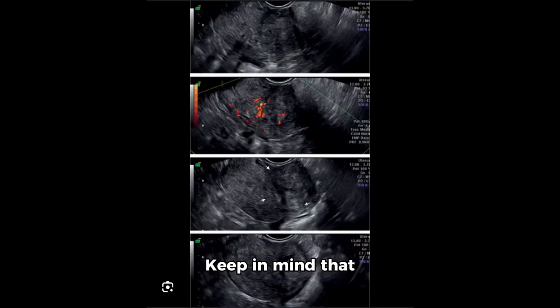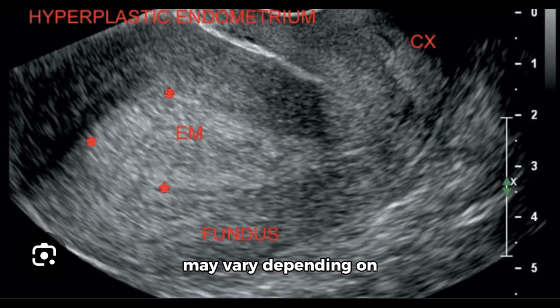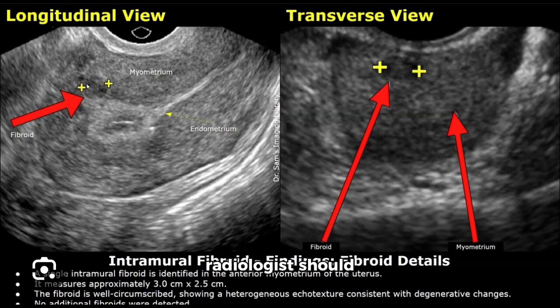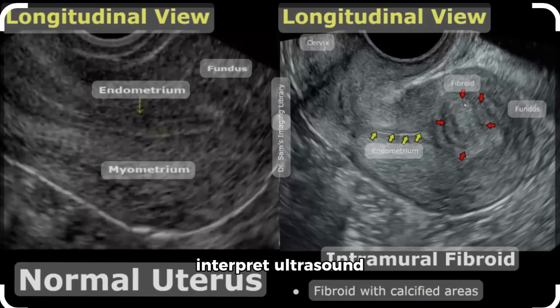Keep in mind that ultrasound features may vary depending on the size, location, and type of fibroid. A healthcare professional or radiologist should interpret ultrasound images to ensure accurate diagnosis and appropriate management.